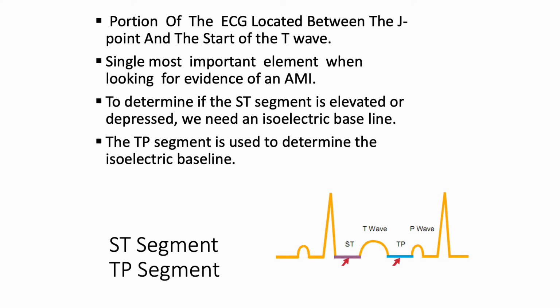So here are the two segments. This is the ST and this is the TP. TP is very helpful to determine the level of the ST. So this is used as the baseline in case of ST depression or ST elevation.